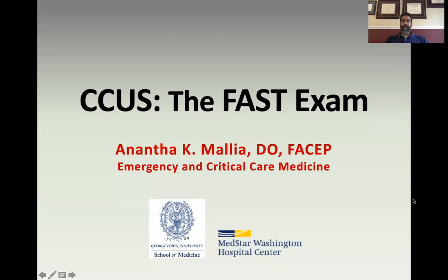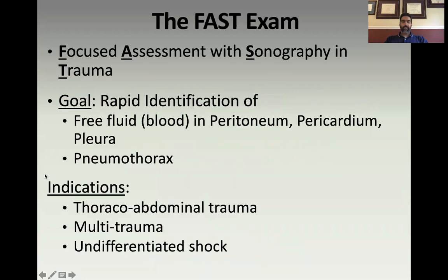All right, let's talk about the FAST exam. The FAST exam is probably the most well-known ultrasound examination out there. It's certainly one of the earliest examples of point-of-care ultrasonography. It's been around for a long time. It stands for the Focused Assessment with Sonography in Trauma.